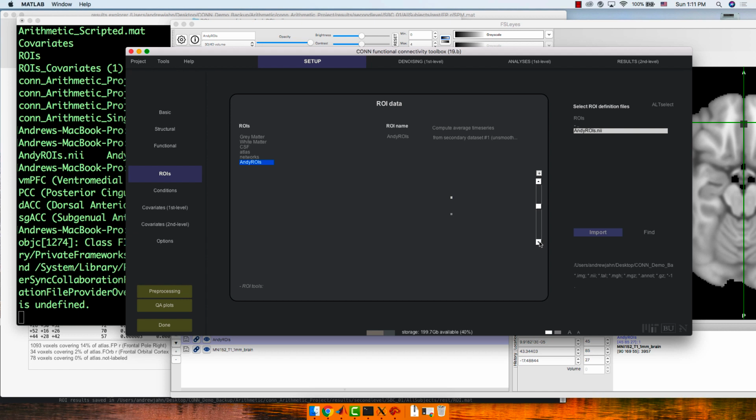Okay. Now, is it better practice to set up your own map like that, or would this be another place where you could pull in something like NeuroSynth? Yeah, you could pull in something from NeuroSynth. You would need to use an image viewer to manually label them as 1 or 2. So if you download a few different meta-analysis maps, for example, I think this is what Dosenbach did actually. You'd find the peak, or maybe define a cluster or a sphere around it, and then fill those in with 1s or 2s or 3s or whatever.